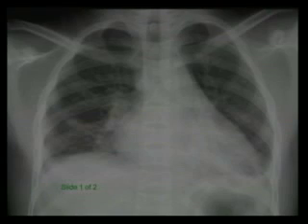Sickle cell disease, very, very common. It's a horrible disease. It's a lifelong disease. They're living a lot longer than they used to. What you classically see, you see an enlarged cardiac silhouette, a big heart, big pulmonary vessels because they're anemic. Anytime anyone's anemic, the heart's just going to pump away because they're anemic. They're going to develop alveolar consolidations. It could be infectious or it could just be from the chest syndrome and the infarcts.